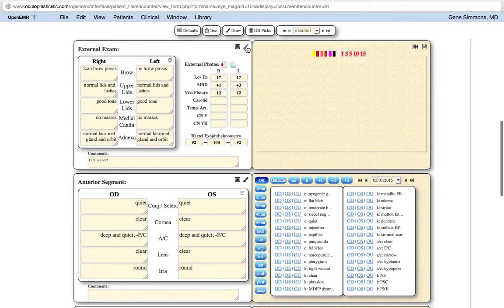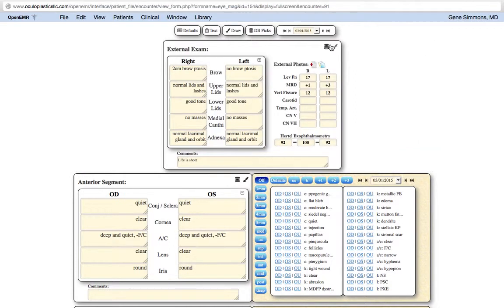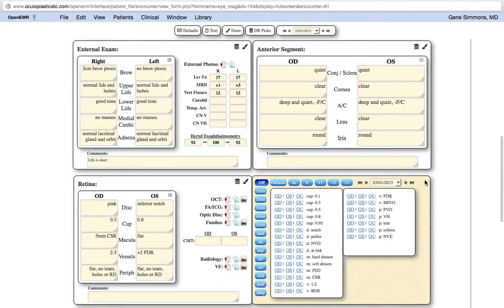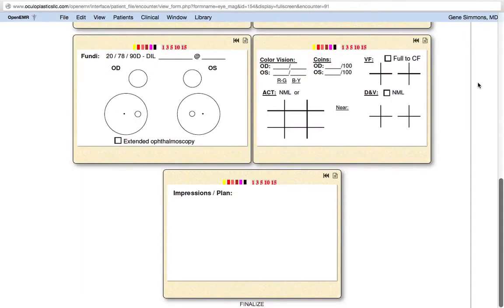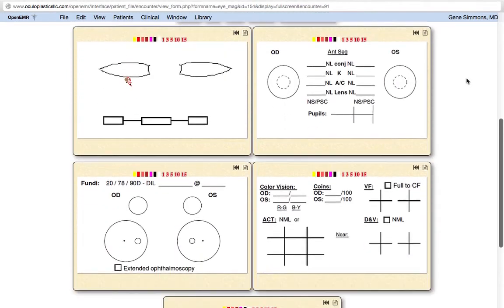You can do drawing as well, and this is an HTML5 program. You pick the color, pick the size of the pen, put the lesions in there, whatever you want to draw. Let's throw in a little bit of black, maybe put a little bigger, and maybe some brown. You get the idea. The functionality is directly proportionate to the artistic ability of the user, in my opinion. So we'll go back to text, and we can do that for each of these. By the way, the drawing program, we can switch completely to draw, and that gives us the examination and all of the images that would be stored for this user.